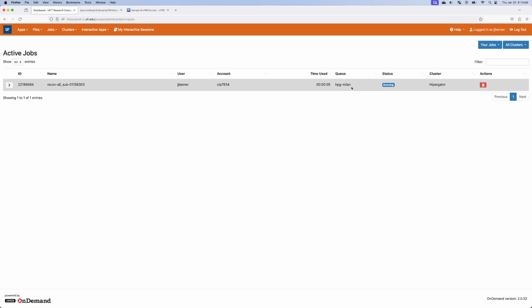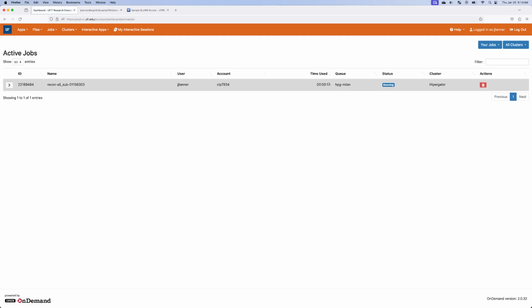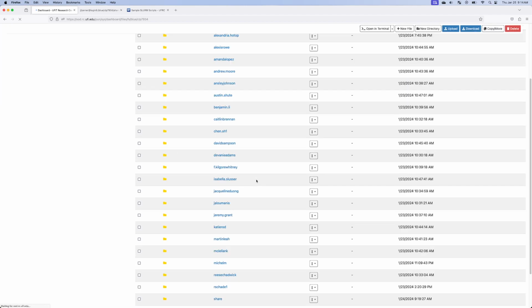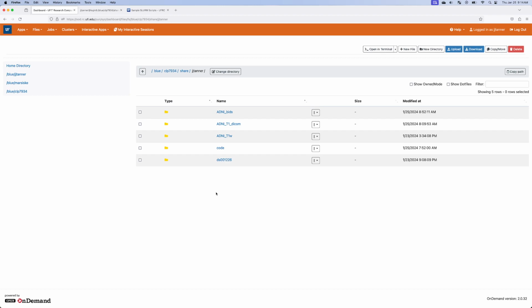Okay, so now I refreshed and it says it's running. It's running on that particular queue. It's been going for 5 seconds. Now, it hasn't done much in that time. Refresh, 19 seconds now. But let me just show you what it would look like. So I'm going to go back to files. Again, this isn't anything that we can look at yet other than a log file.